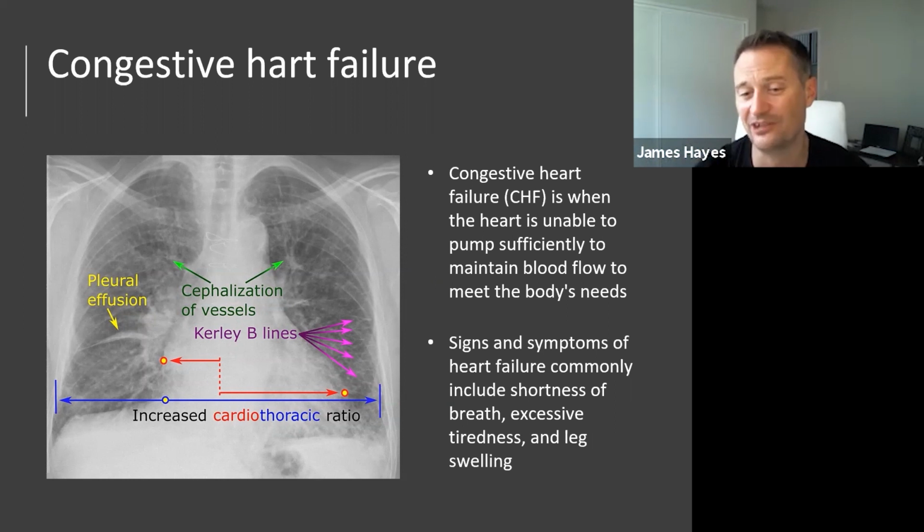So do you remember I said the chest x-ray was kind of like a get out of jail free card? This has got so much information on it. But then what else are you looking at? What other stuff can you see about that patient? Okay, because when you get that image, you might get the image before you get the patient. So you've got to say, well, yeah, they're in heart failure, okay, which isn't good. It's not terrible. You know, it's not the worst thing you're going to see probably that day.